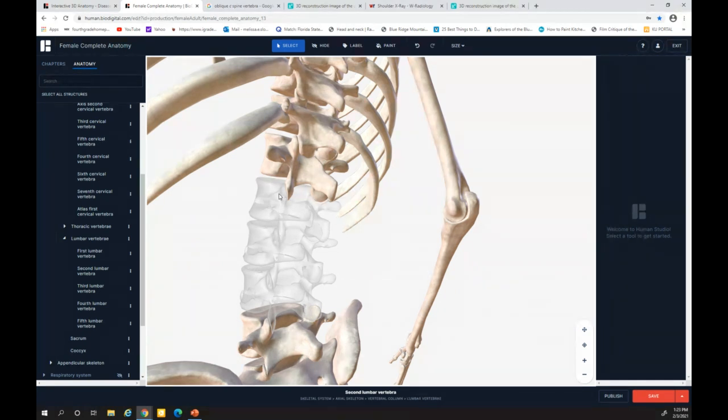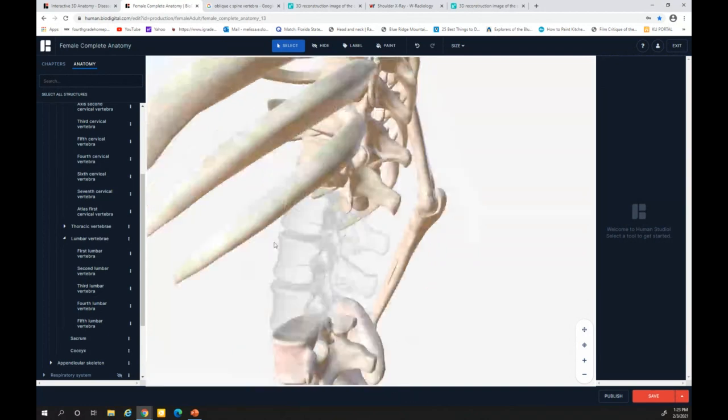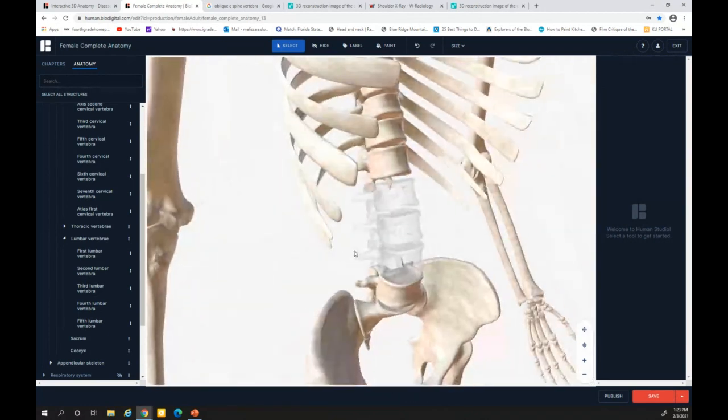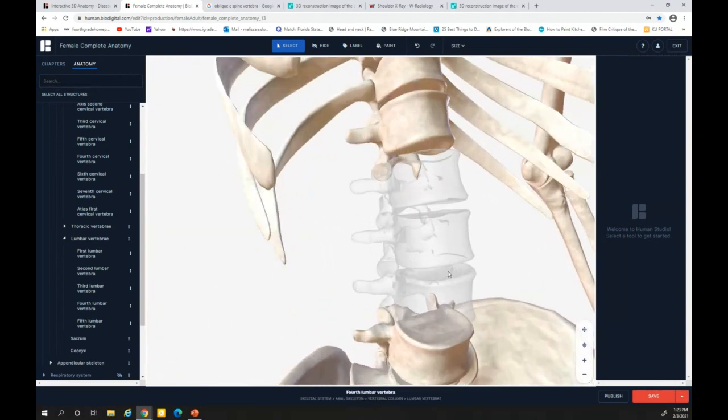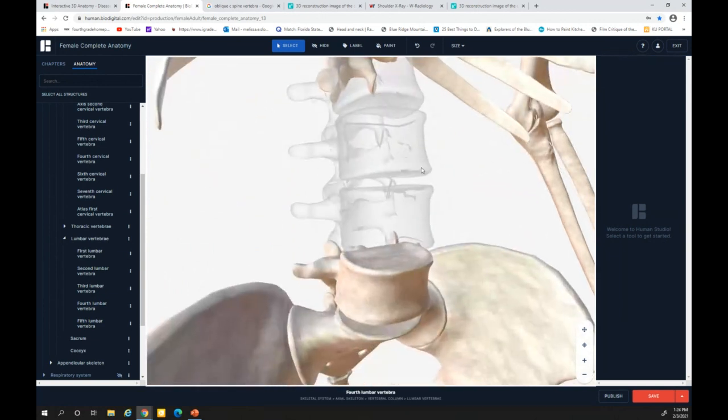So when we take our x-ray like this, here's our patient, we took the x-ray, we're going to look at it like this. But unfortunately, this doesn't really show the dog as clearly as we would want it, but you can see he's on the body of the vertebra.